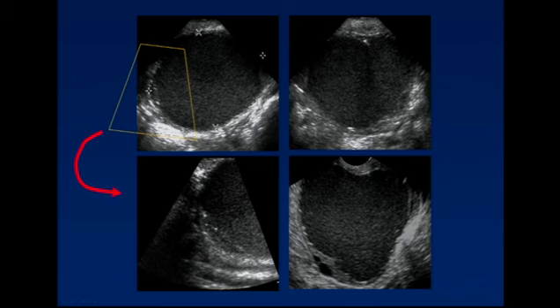When they lyse, as they do in an endometrioma, and fall to the edge of the endometrioma, there are phagocytes in the ovarian parenchyma that will chew up that cellular debris. The cholesterol is indigestible. It gets stuck in those phagocytes and then forms these echogenic foci, which resemble the cholesterol deposits that one would see with adenomyomatosis in the gallbladder. In fact, that's what we think these things are: small cholesterol deposits on the wall of a chronic cyst.